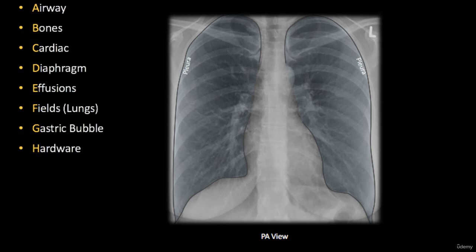The fields of the lungs should not be absolutely transparent. We have some soft tissues, we have vessels, bronchial trees, which you see here on the right and on the left, running up and down from the roots of the lungs. Some shadows are the bronchial tree, and smooth lines all the way around belong to the vessels.